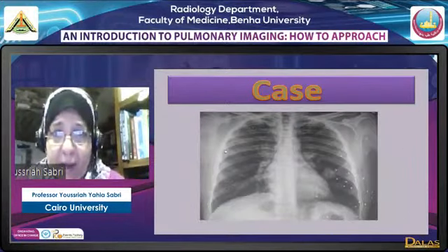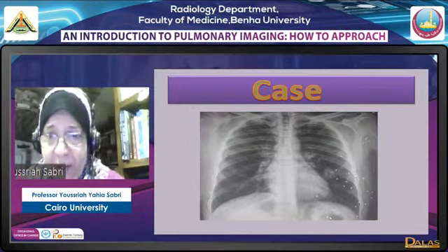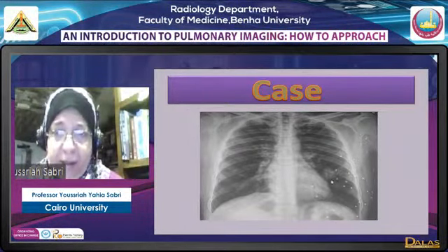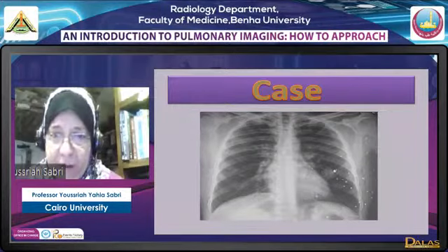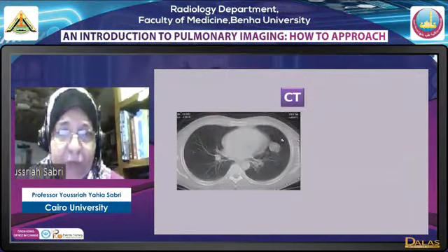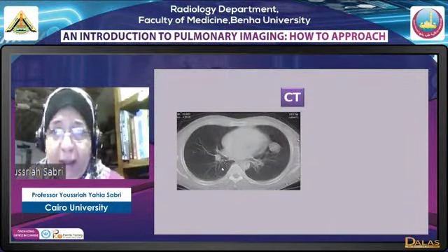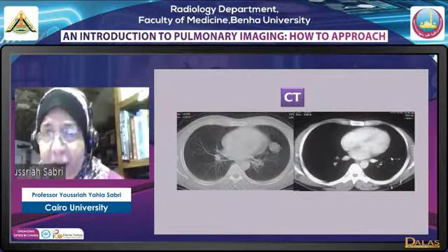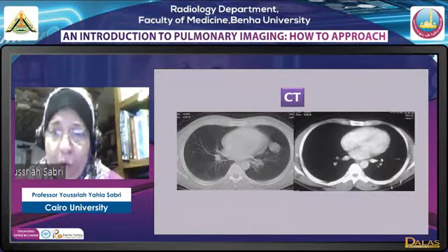This case is a young male patient. He was at a wedding and he got some gunshots, as you can see. He went to do an X-ray and an incidentalloma was present, a lesion that is incidentally discovered. He did a CT and the mass was seen in the lingula, in the lung window, while in the mediastinal window no lesion whatsoever was seen. So where did the lesion go? Simply, it's a fat density similar to this. Fat density, we are dealing with a lipoma of the lung, which is an extremely rare lesion.